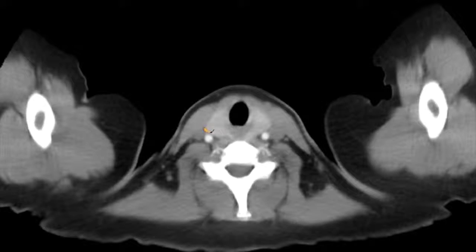We start at the bottom of the cricoid cartilage, and the highest density of SCV, meaning supraclavicular recurrences, are in the medial SCV, which is behind the sternocleidomastoid muscle in front of the scalenes extending to the medial border of the carotid artery. This is the same as level 4 in head and neck anatomy.